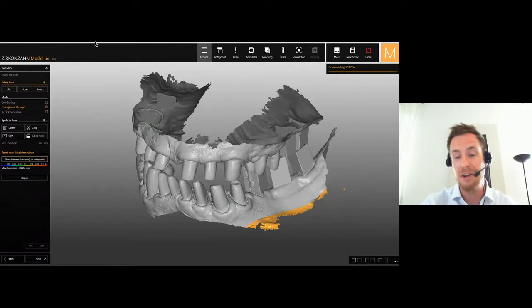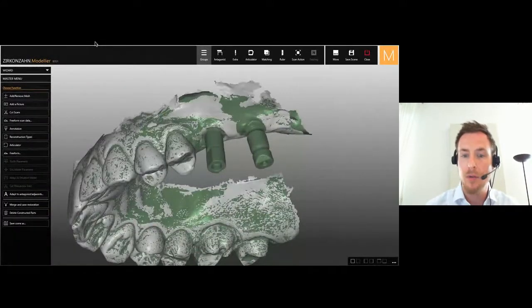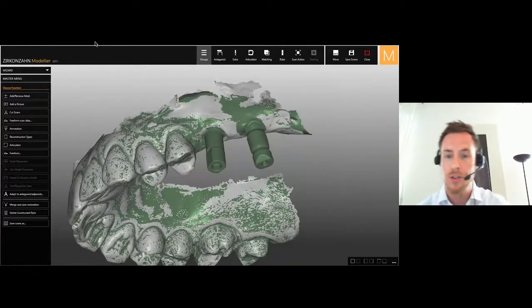Of course, a lot of clients would now ask what he is doing there, because those kinds of scan flags are usually just for the model. That means if I want to detect the implant position from a physical model. But if you have space in the patient's mouth, you could actually use those also in a patient's mouth. A combination of scan flags and dies is not a problem at all. And those are the two other scan flags I want to talk about.